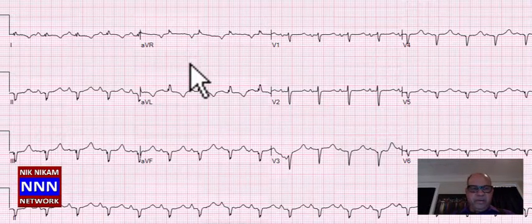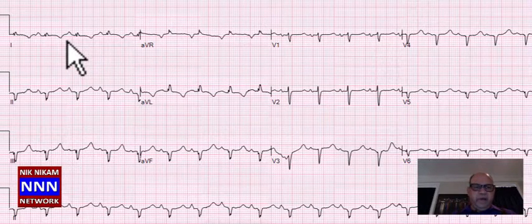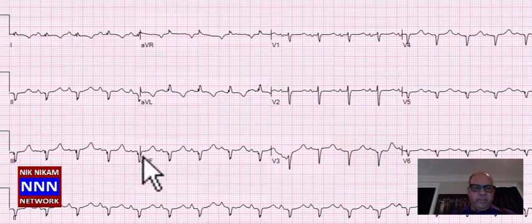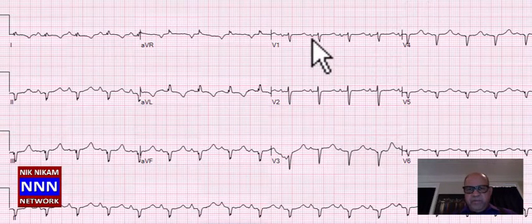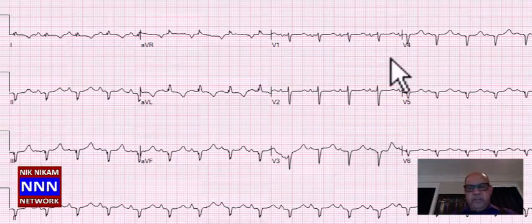This is a fascinating electrocardiogram. Here first of all, we have low voltage. Number 2, there are QS complexes in 2, 3, AVF that are suggestive of old inferior infarction, left axis deviation, left anterior hemiblock, and here we have a negative deflection which is perhaps equivalent to one complete box. So we have left atrial enlargement. There is lack of R wave progression all across the chest leads. That is suggestive of poor R wave progression.